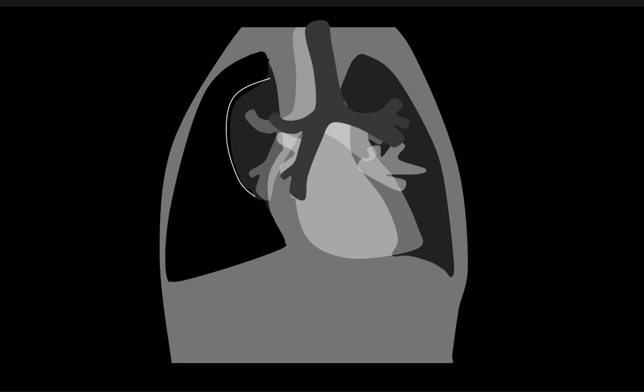So if you see a large pneumothorax, even if the heart is still sort of centered in the midline, if you see that diaphragm getting pushed down there, that's tension physiology. That means there's some extra pressure in there, not just on the diaphragm, but on some of the blood flow potentially returning to the heart, which can be very serious. And obviously this has to be addressed with a chest tube sooner than later.